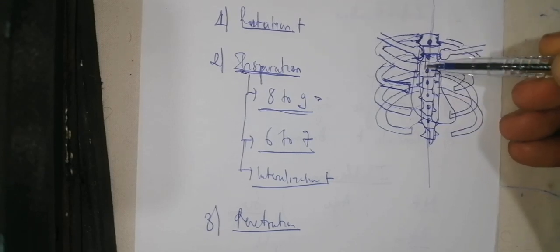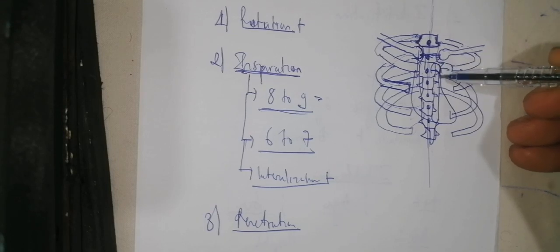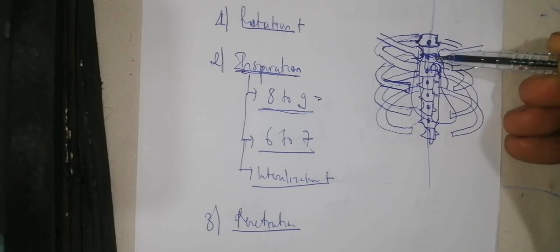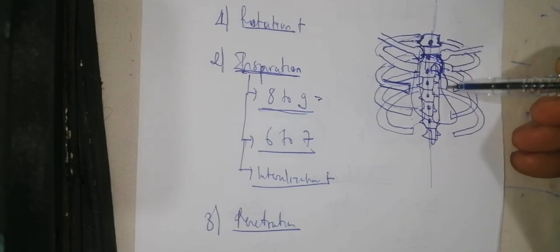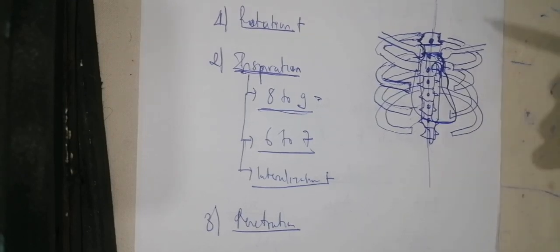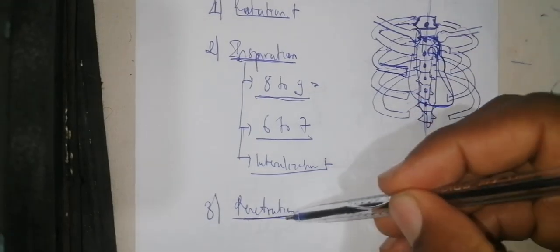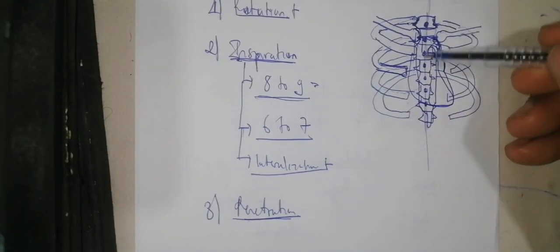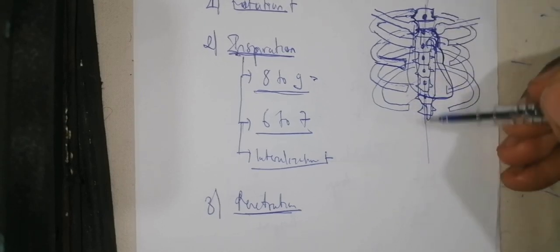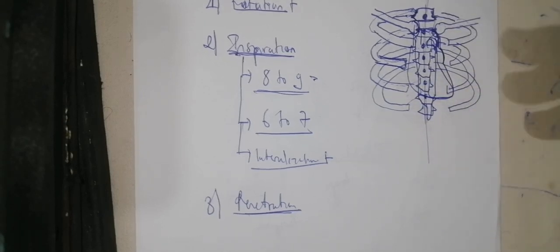You are going to have a superior vena cava. You have the aortic arch, which is going to produce different arches. The first arch is the aortic arch. The second arch is the pulmonary trunk, and then the last arch is the left ventricle. So those are the different things. Now, for the penetration, we need to see the vertebral column or the spine behind the heart shadow for you to see that it's a good penetration.